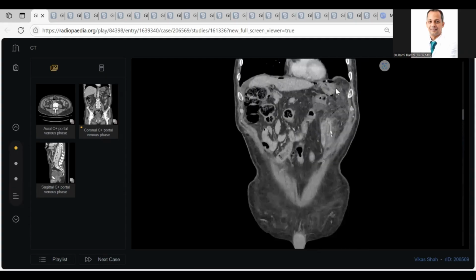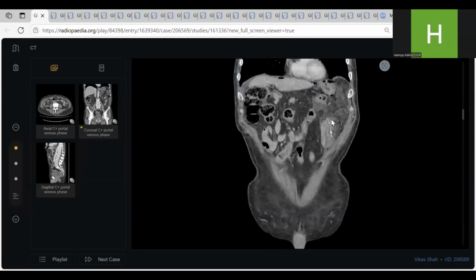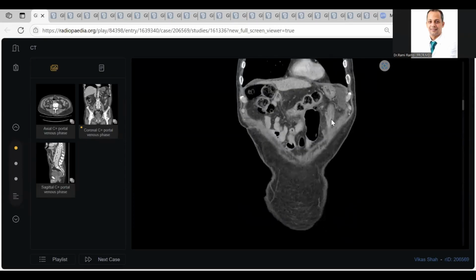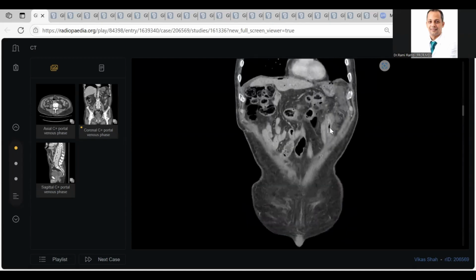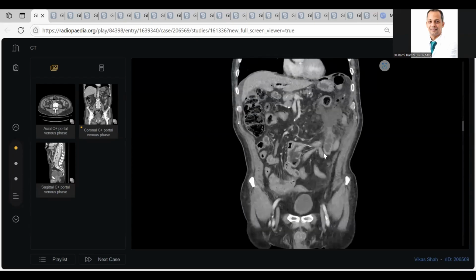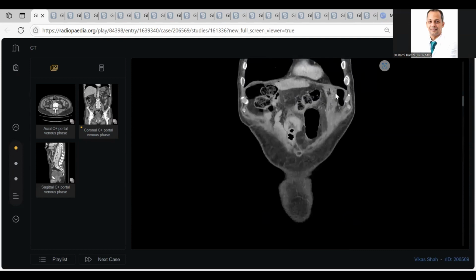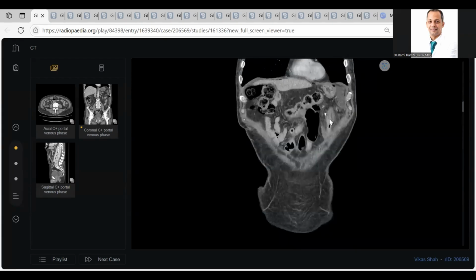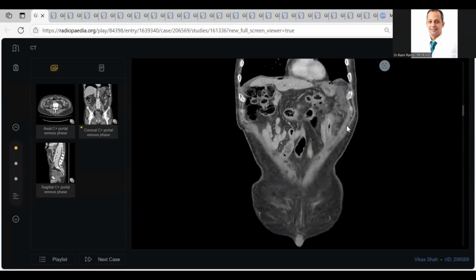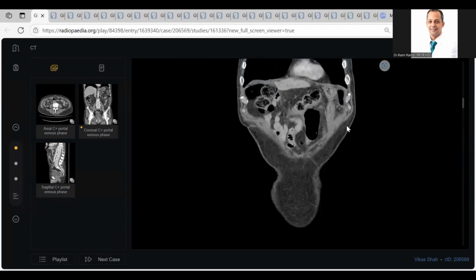See my colleagues here. Then try to ask for other planes. This is the stomach. Down, there is a longitudinal bowel. So this is a gastrojejunostomy. Again, this is the stomach, some diaphragmatic, and there are some rugae, and it is connected here with something longitudinal, another bowel. See? So this is a gastrojejunostomy. Thank you so much.